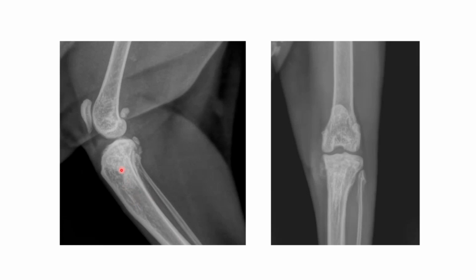The zonal transition is pretty indistinct. We can potentially see a very faint boundary, but it's difficult to know where that stops and where it starts, particularly in this caudocranial view. If we look very carefully at the medial aspect of this proximal tibia, we can see that there are a few little areas of punctate lysis of that cortex. So there is some evidence of cortical destruction, and there's a little wispy periosteal reaction on the medial aspect of this proximal tibia, particularly caudally in this mediolateral view. There's also some soft tissue swelling associated with this lesion.